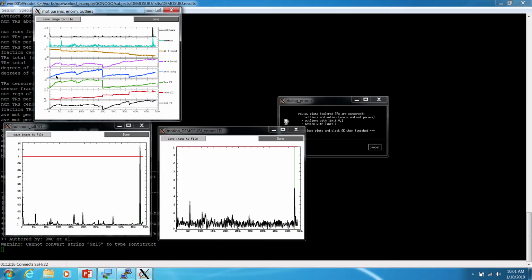You'll notice there's a few alterations here that occur here, here, here, and here, essentially kind of breaking things into fours. As you might expect, the reason that's happening is this is the first run, this is the second run, this is the third run, and then the fourth run. So what happens is there tends to be more movement between runs because the task isn't happening. They're within our motion tolerances, but that's why you see that stair-stepped thing. Okay, so these all look good.